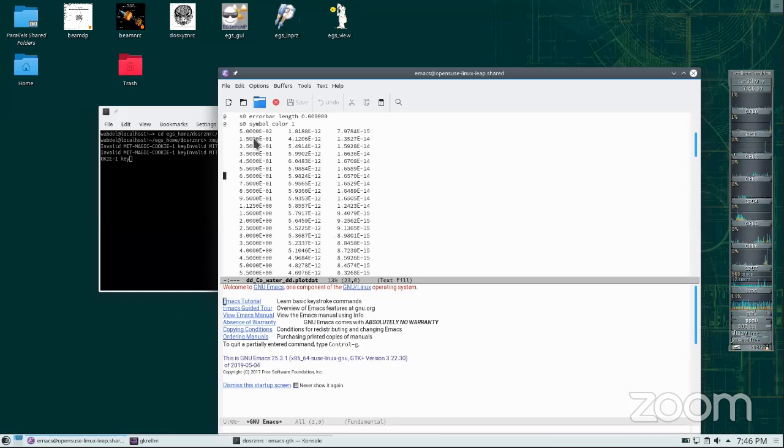Look at these doses, they are reported in the middle of the region. So we should have something at 10. I think this is 10. This one is 10. So that is the dose, okay? And this is the uncertainty.